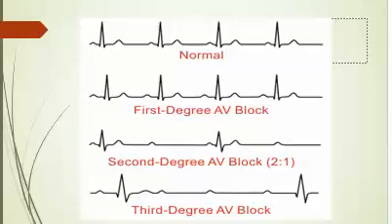They are not associated with each other at all. So remember, when you look at your third degree heart block, you're always going to see more P waves, because the SA node is throwing out its inherent rate of 60 to 100, and the ventricles are doing their own thing. There's no association. There's nothing going through. And the sad thing about it is a patient can't live like this. We have to get them a pacemaker.